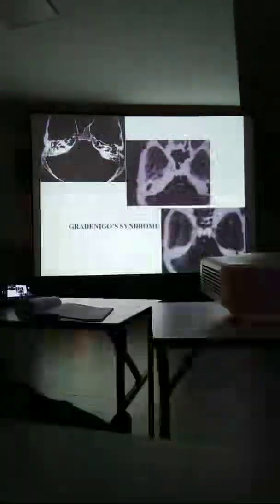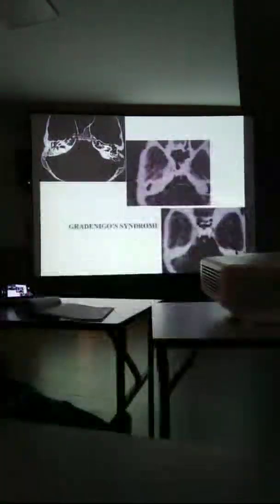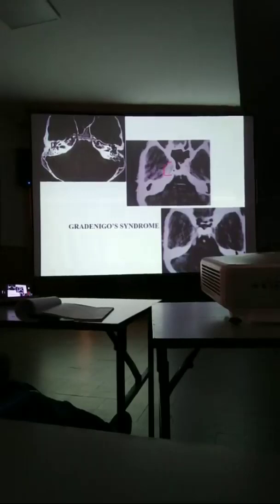This patient presented with 5th and 6th cranial nerve involvement. We can appreciate the enhancing lesion in the parasellar region. You can see the parasellar Meckel's cave along the 5th nerve, the lesion is coming. But the source, if we look carefully, is the mastoiditis and the apical petrositis, petrous apicitis as well as mastoiditis. And involvement of the 5th and 6th cranial nerves, it is Gradenigo's syndrome.